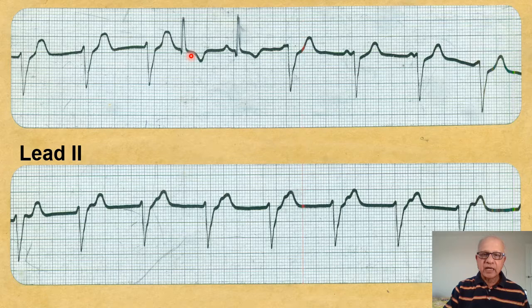The sinus rate, as I told you, is 75 beats per minute. Now it is intermittently capturing the ventricles, right? So the sinus is present and it is active, but somehow the accelerated idioventricular rhythm is overriding the sinus whenever the sinus rate goes below 60 per minute, right? So simple method will be just you accelerate this sinus rate.